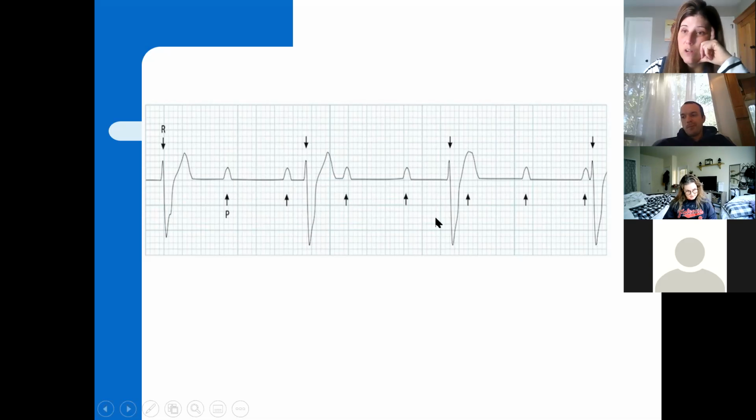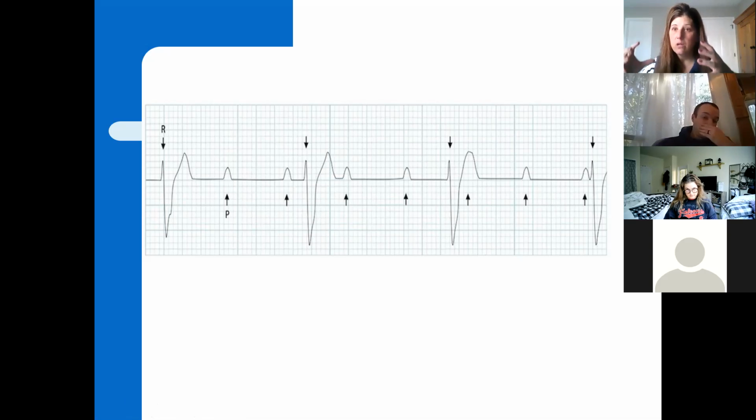And then you're trying to figure out what your rhythm is. This is a complete or a 3rd degree heart block. Okay? I think you guys are doing fantastic. You're asking excellent questions. It sounds to me like you're getting a good grasp on it. Again, if it helps you to separate things in buckets or nuggets, I think that's a good way to learn.